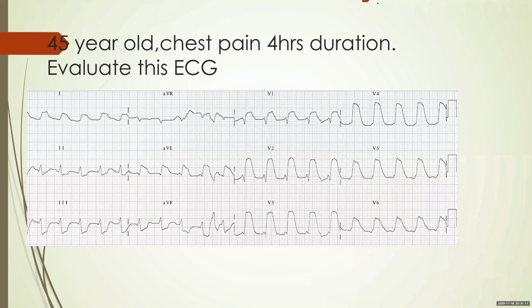This is a 45-year-old male who is having chest pain of 4 hours duration. Now let's imagine that you have not seen the patient, the nurse brings you the ECG, and let's see what information you can get from this given ECG. If you require further time, please press the pause button or you can go ahead with the video.